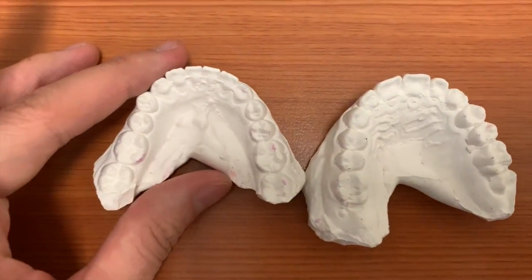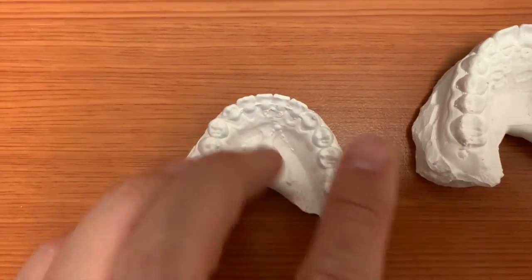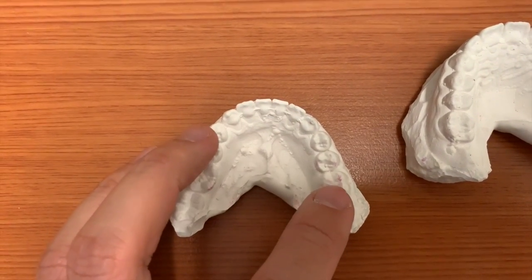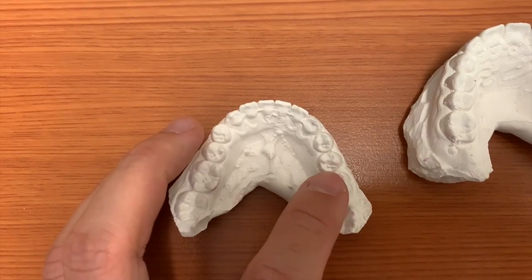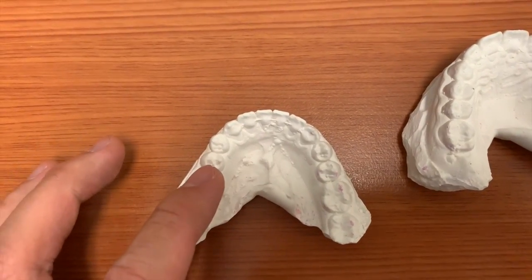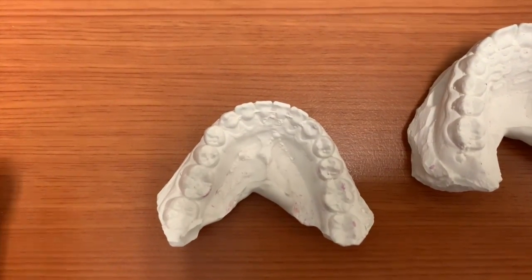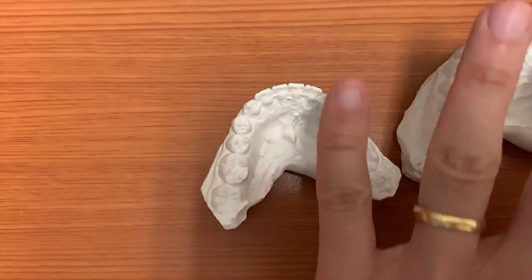If you look at another example here, you can see on these sides small bubbles on the teeth, which generally are not part of the teeth anatomy or the shape of the teeth. They're more just inaccuracies that come about when we take a mold of the teeth to make retainers. Contrast this with how we make retainers now.